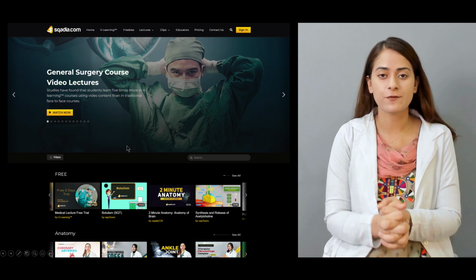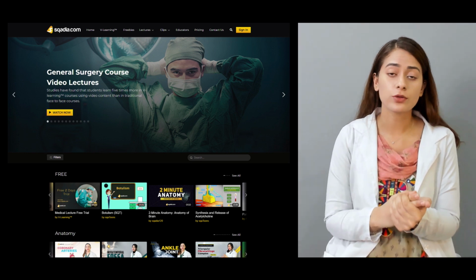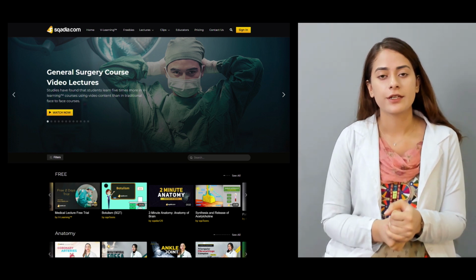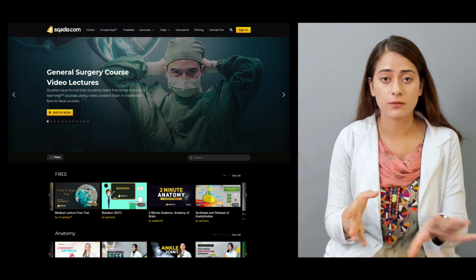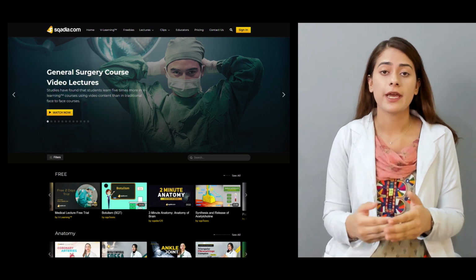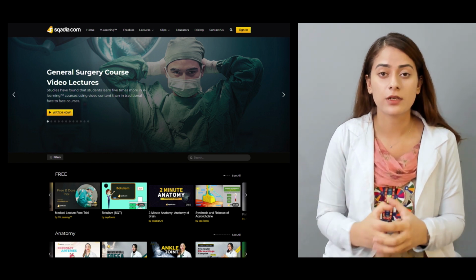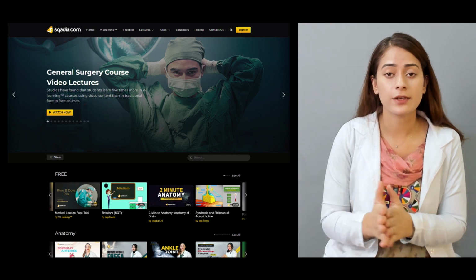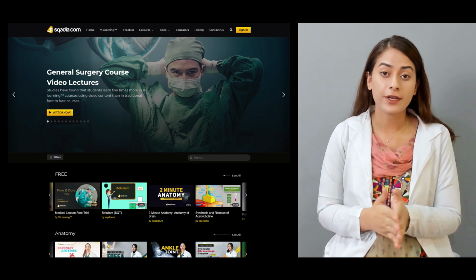So that is it for today. We discussed the chronic conditions of the shoulder in detail. We saw how they appear on radiographs. We discussed many conditions starting from shoulder impingement, and we discussed how different joints of the shoulder complex are affected by degenerative joint disease or osteoarthritis.